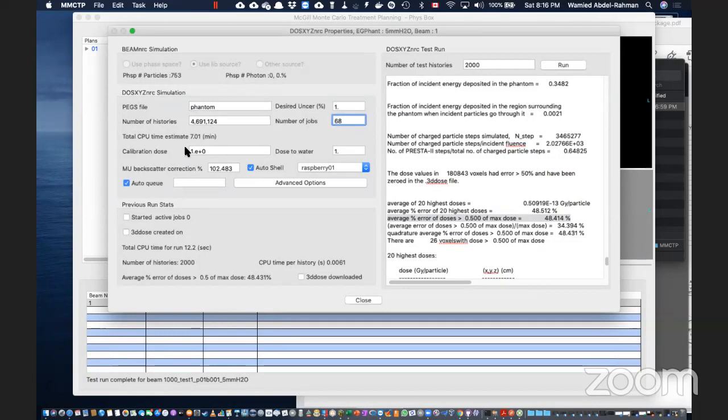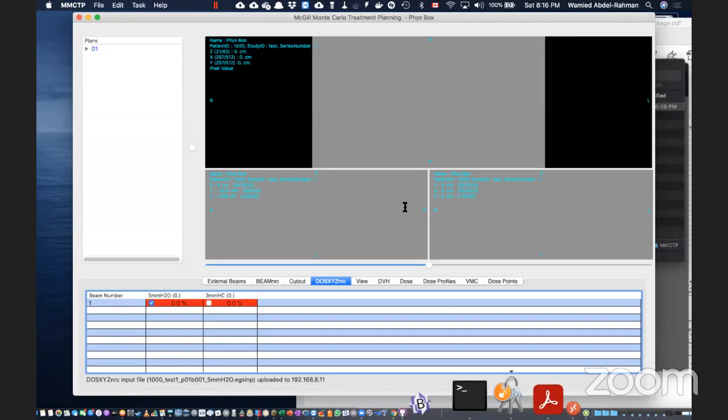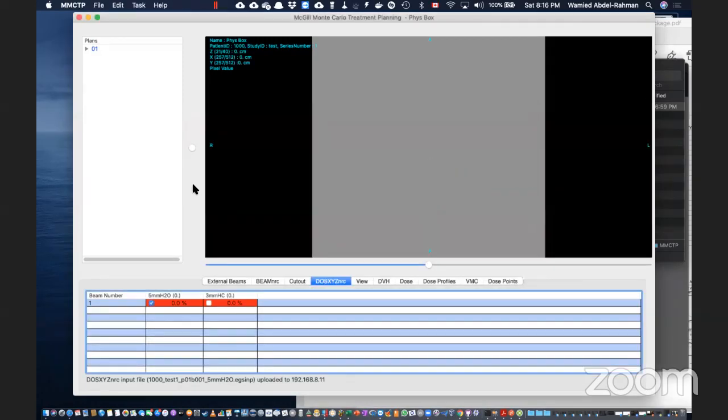And we will leave this for the time being. So now we'll hit close. And then I'm going to click on this, and now it's creating it, uploading, and I should start to see my queue being populated. So there it is. Okay, so now we can do the view. Right. So what I would do, I go to view.